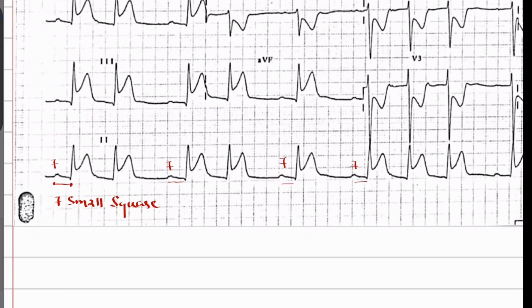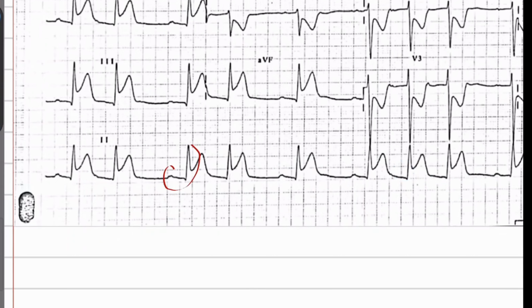Like when you talk about Mobitz type 1, it's prolonging in every beat and then skipping a beat. Okay, so we can conclude that it is a case of a prolonged PR interval, but it is regular. This can be sinus beats only. Since the P waves are followed by QRS, these are sinus beats only. Okay, sinus beats.